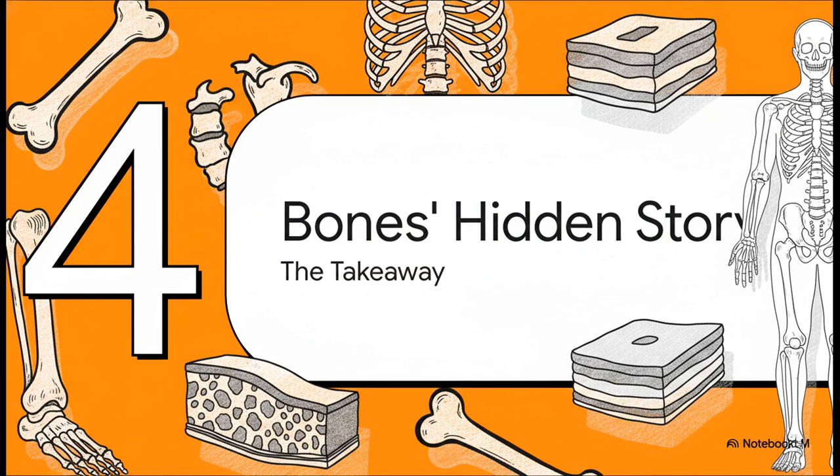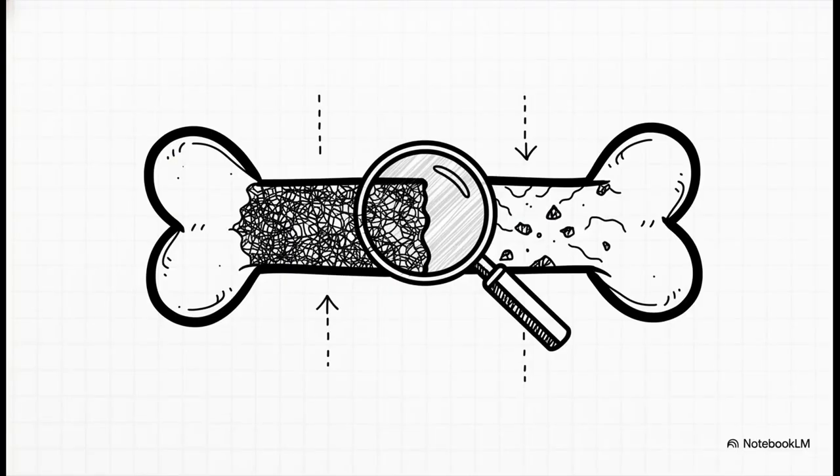Which brings us to Section 4, your bone's hidden story, the takeaway. We've spent this explainer looking pretty closely at the foot, right? But these visual clues absolutely apply to your entire skeleton. Understanding how to look at an X-ray, actually seeing the shells, the sponges, and those washed out shadows, gives us profound insight into our invisible structural foundation.